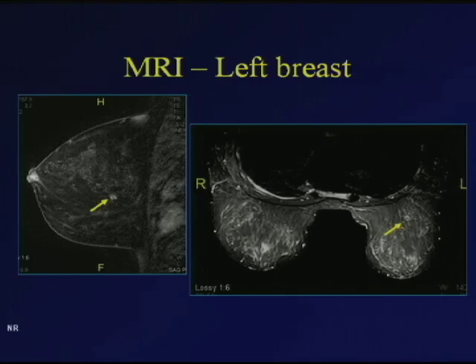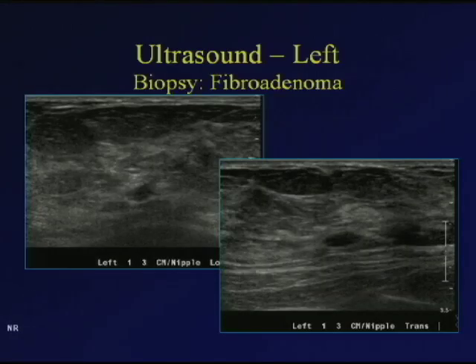And in the left breast, we see a mass which is just below the nipple line on the sagittal view. It's at approximately the junction of the middle and posterior thirds of the breast. And it's just a little lateral to the nipple line on the axial view. And on ultrasound, we go to the outer aspect of the breast, expecting it to be a little bit lower. And we see the mass at 3 o'clock.